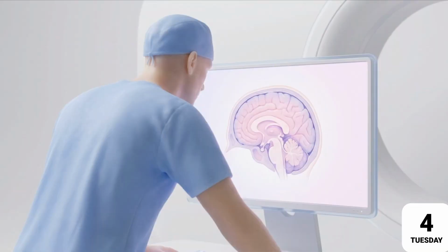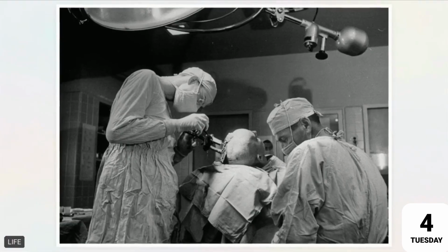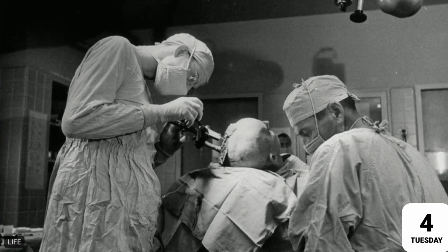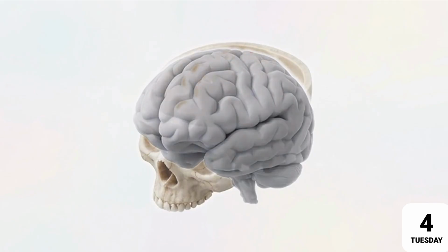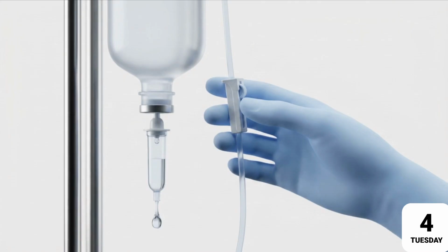We are back in the ER, staring at the monitors. The gray pixels have rendered their verdict, and the medical team knows exactly what physical action they need to take next. A bright white mass confirming a hemorrhage means an immediate trip to the operating room. Surgeons must drill into the skull to relieve the intracranial pressure, drain the blood, and attempt to repair the ruptured vessel. Conversely, if the scan reveals a dark, hypodense patch and definitively rules out a bleed, the team is safely cleared to administer systemic clot-busting drugs to restore blood flow.